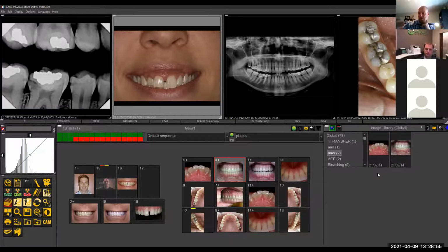So images, again, are trust with proof, and back up what you're saying, and it's very easy for you to utilize this in a systematic, easy way. They'll see the need for treatment. They'll understand by seeing both internal and external information, and then you start to show them the work and the options.